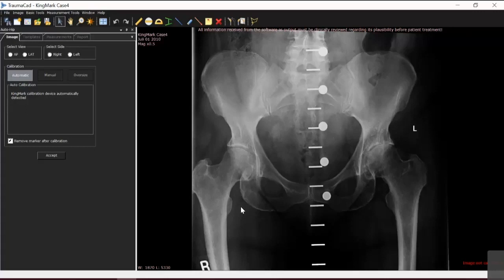Now, as I said, the standard projection is a low-centered AP pelvis if it's a case going for a total hip arthroplasty with the legs internally rotated 15 degrees. And of course, the parameters are different for different parts of the body. If this was a case that was a deformity correction, one of the most important things is that there's an extended film focus distance.